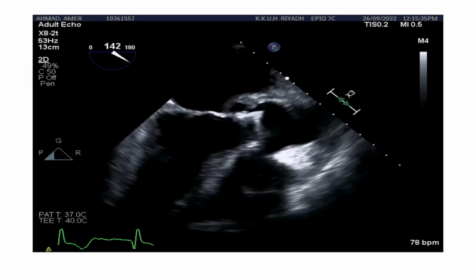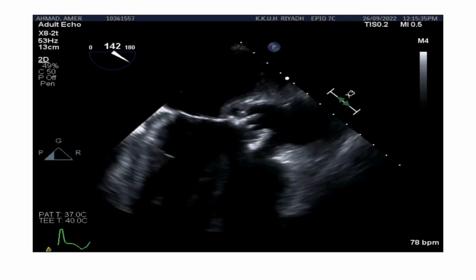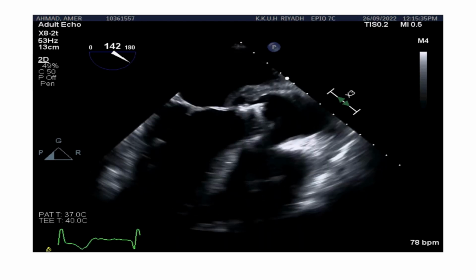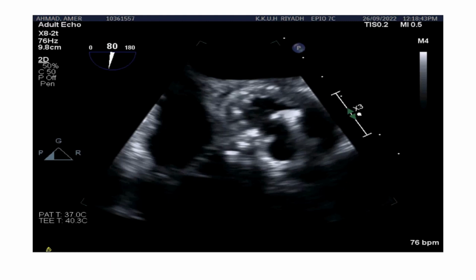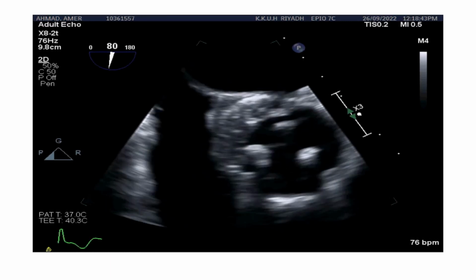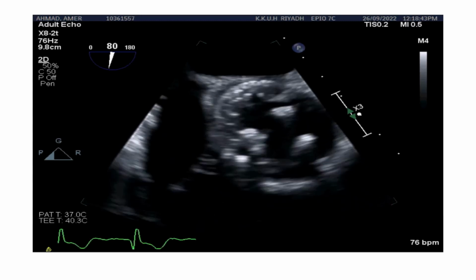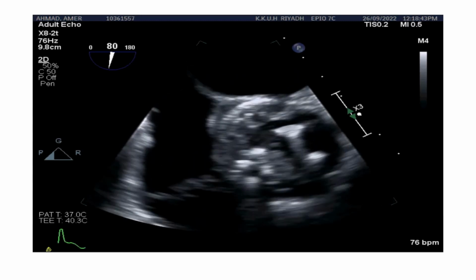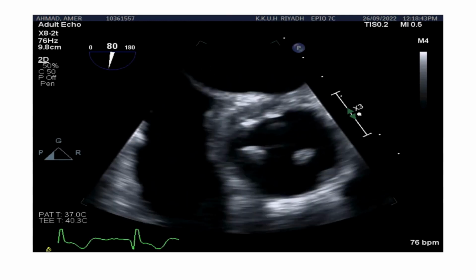Yes. Okay, so it seems that all of us are cardiologists, no surgeon here. That's good. No. So this is an abscess, a proven abscess, and it is worsening. In spite of antibiotic, and the fever disappearing and culture becoming negative, still we have complications.